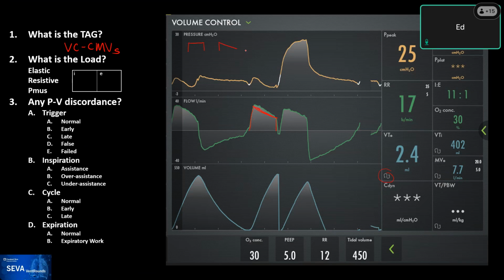Some ventilators may have a sinusoidal waveform, but there's not many that do that. Well, what this ventilator manufacturer decided to do is that one, you can set the rise time for the flow, so you can alter it so that it has a slope, and it's based on time. So you set the time that it takes to reach the peak flow.